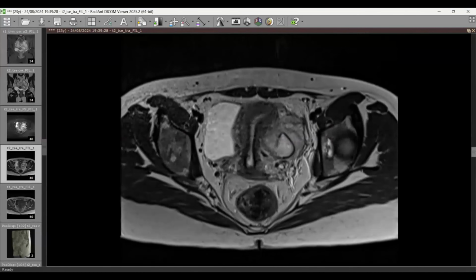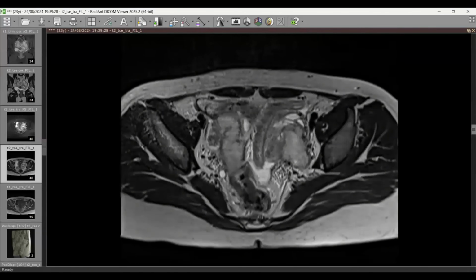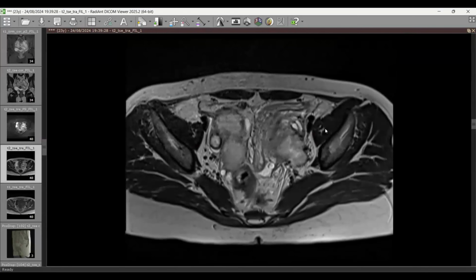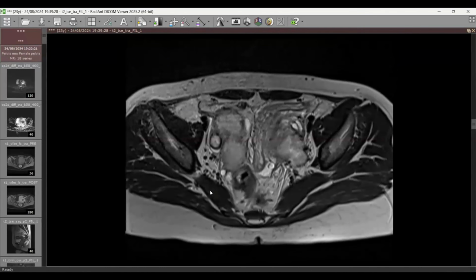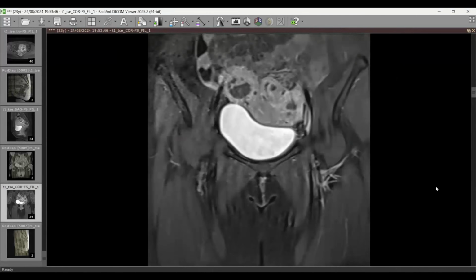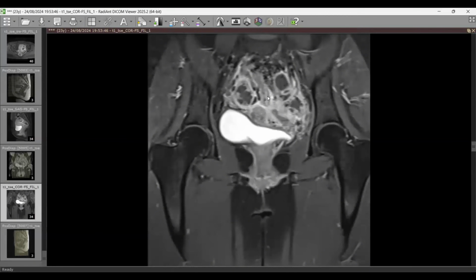I don't think you should have spoken about a neoplastic disease first, although the appearances could be similar, there is more of inflammatory reaction going on in both the adnexa. Then I showed you the diffusion weighted, there was diffusion restriction, and on post contrast sequence you see peripheral enhancement with internal enhancing septation and surrounding inflammatory changes. So this was a case of tuberovarian abscesses.